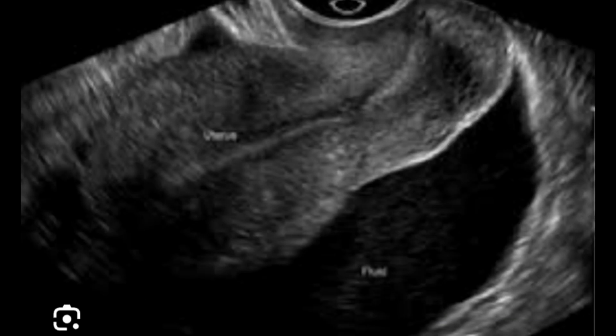After explaining the fluid within the endometrial cavity, mild and moderate, and also discussing its physiological and pathological processes, the next is fluid in the cul-de-sac. You may call it the pouch of Douglas or the cul-de-sac, whatever you please. In that case you can see mild to moderate degree fluid in the cul-de-sac. Again, you will have to look for both physiological and pathological processes. During menstruation, early menstruation and pre-menstruation phase, there may likely be small fluid within the pouch of Douglas and cul-de-sac. This would then be physiological.